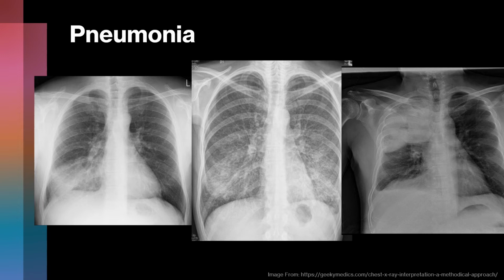different types of infection within the lung, otherwise called pneumonias, and these will most commonly be seen through a patchy white consolidation throughout the lung. And in fact, there is actually a special sign that we can see on the image on the right, which is your bulging fissure sign. And this refers to a lobar consolidation.